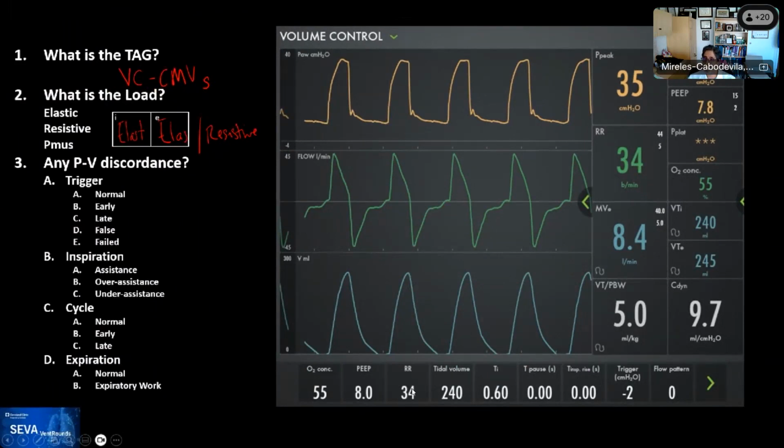34 breaths per minute. So it's essentially, I don't even know how to mention this. It's a failed trigger, actually, if anything, because it didn't trigger the ventilator. It's triggered by the machine. So it's just so aligned to it that it looks, I mean, it's essentially marching out one to the other.